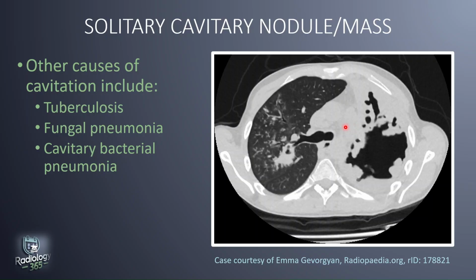So in this CT, which is a case of post-primary TB, we have massive alveolar consolidation in the left lung with some bronchiectatic changes as well as cavitation, a big cavity in here. The teaching point here is that cavitation occurs in the context of pre-existing disease. So you may have had a nodule, a mass, a consolidation, and then this now cavitates.